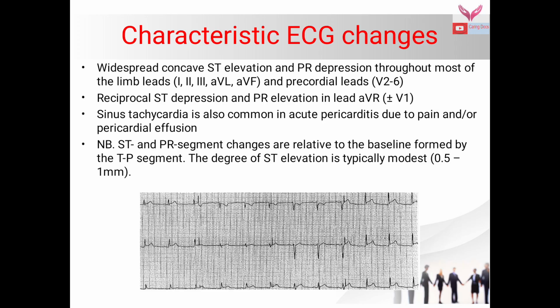Sinus tachycardia is also common in acute pericarditis due to pain and or pericardial effusion. The ST and PR segment changes are relative to the baseline found by the TP segment. The degree of ST elevation is typically modest, that is 0.5 to 1 mm.